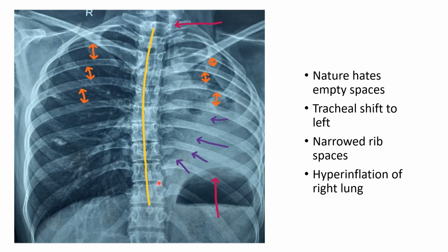So that's called the herniation of the lung. Finally, you see the spine. So this spine is here, right? If you see, there'll be a subtle concavity to the spine. This end is closer here, and this is a sort of C-shaped concavity, and this concavity is towards the lung in which there is a volume loss, towards the hemithorax in which the volume loss is there. Because both ends are likely pulled, something like that.